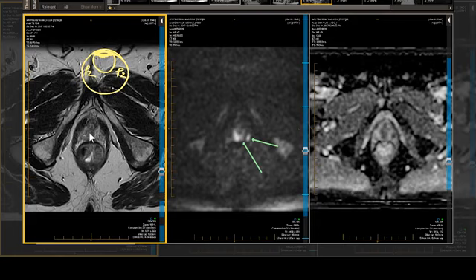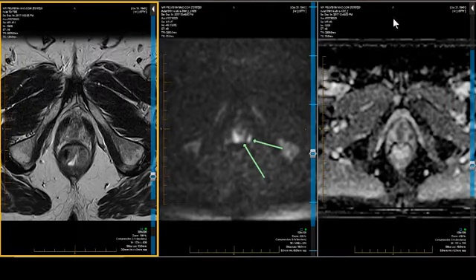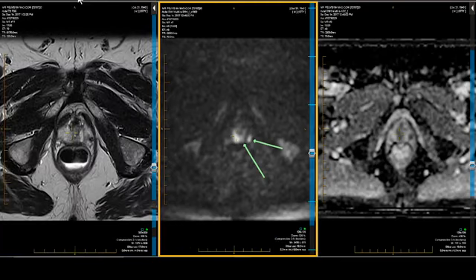So in the back, in the region of the PZM and PZP, say PZP right here, and PZM right here, we've got a trapezoidal-shaped abnormality. So let's look at it, and I'm going to call up the 1600 B-value diffusion image. And there is a bright area corresponding to this area. If we position our cursor, they are in the exact same position. There they are.